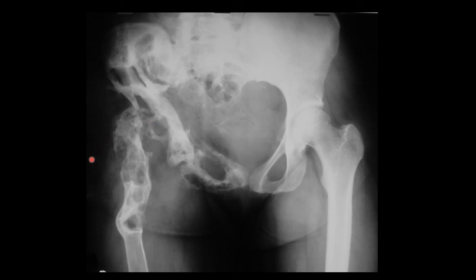Lastly, here's just an X-ray to show you advanced disease of the right lower limb girdle. This is not a tumor, despite it looking like a tumor. This is an infection. It's very unusual for a tumor to cross joints. Generally speaking, tumors will stay on one side of the joint. When you see involvement both sides of a joint, it's more likely to be infection. Clearly, this is an infective process that's taken a long time.